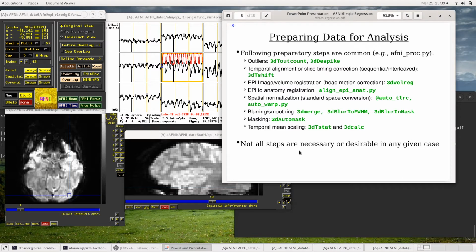Most of the head motion would stay more in plane in a sagittal acquisition. But now that we do volumetric registration, we can pick a more compact or convenient slice package, which is typically axial. You need fewer slices to cover the brain.